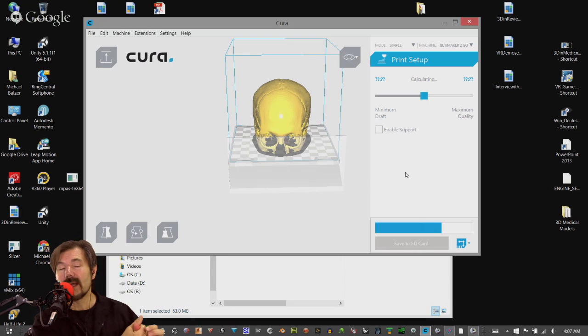So on that, let's wrap things up. Hopefully, Javin, that gave you a great overview on how to get from one point to another. I apologize for not being able to show you the volume ROI directly, but trust me, it is there, and it will allow you to clip specific areas just like we did now in order to create the tangible model. But as you can see, after you get used to it a little bit and work with it enough, it's a very powerful tool.